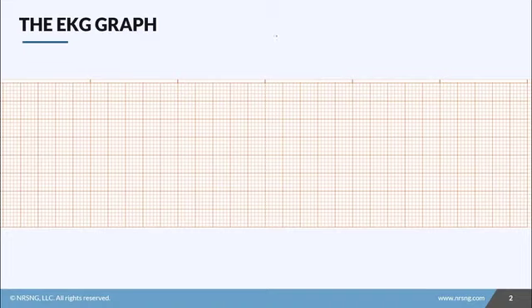In this lesson, we're going to break down an EKG graph. After this, you will no longer fear those EKG papers. Okay, so here we have an EKG graph paper. As you can see, there's a bunch of large boxes and smaller boxes. We're going to break every single one of these down.